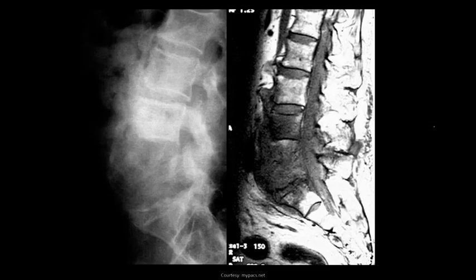Here's another example. This one's just a really, really bad, really widespread change. And this one, I mean, you could definitely think tumors with this. This is just a lot of destruction. The discs themselves, you can't really see where the vertebral body is. Like I know it's somewhere in here because I can kind of see some stuff, but I can't tell exactly if those discs are involved.